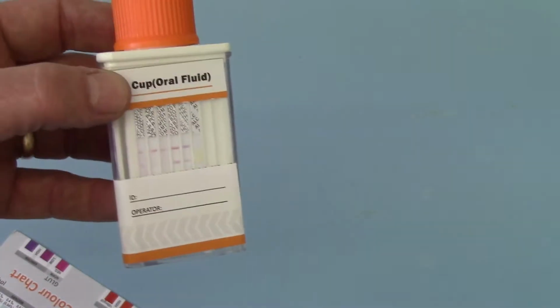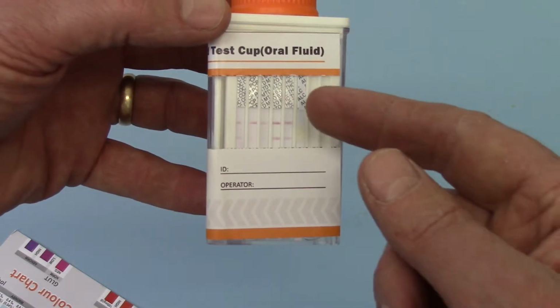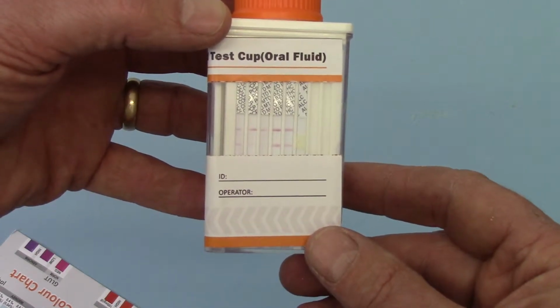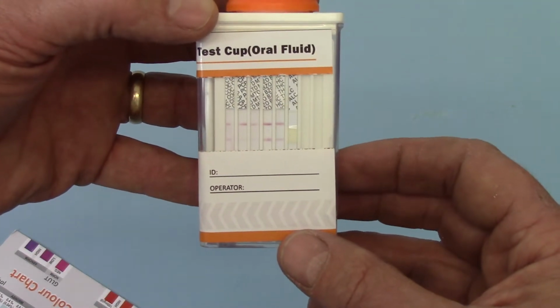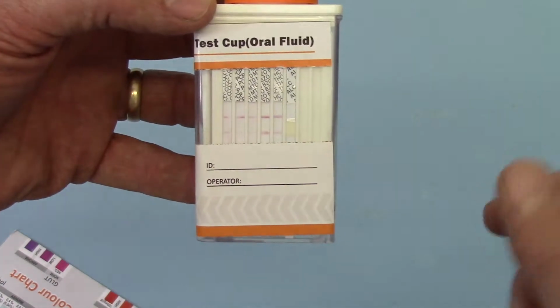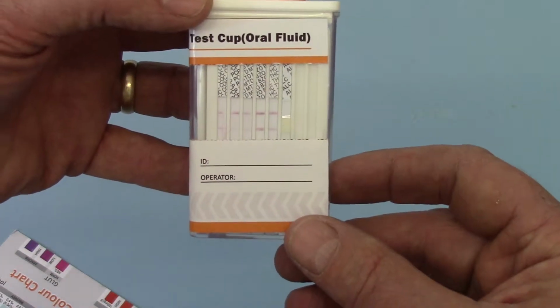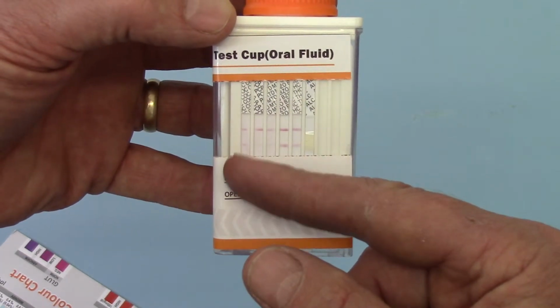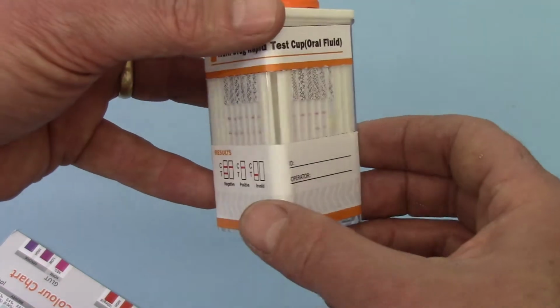And then if we come to the drug tests, we've got 2 rows of these, and you'll see on this first row next to the alcohol you've got THC, followed by benzo, methadone, PCP and cocaine. And you'll see along the top you've got your control lines. They vary in density and colour saturation, and below that, nearest where the sample ran through, you've got your test lines. And again, you'll see quite a bit of variation in these, but these are all negative results. You've got faint test lines for both methadone, PCP, cocaine, and then the cannabis and benzos, stronger negative test lines.